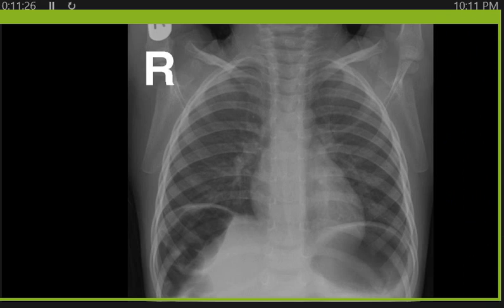Anyone for the next case? Pneumoperitoneum. Could be chilaiditi. Again, I try to describe the procedure and what you see, and the findings, and then we need the diagnosis or differential diagnosis.